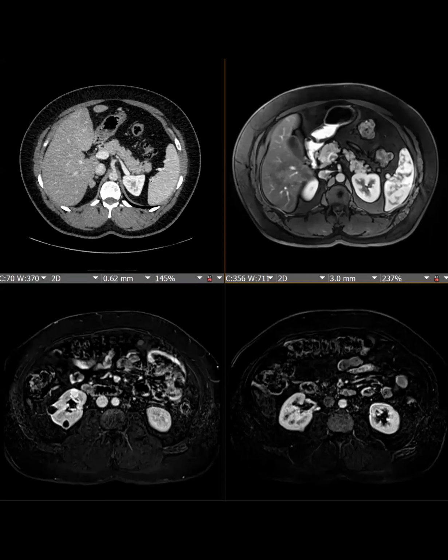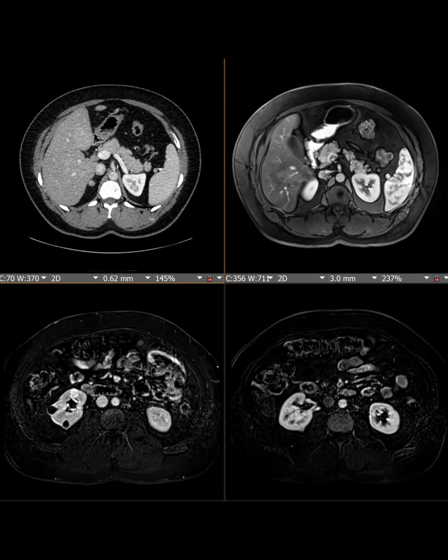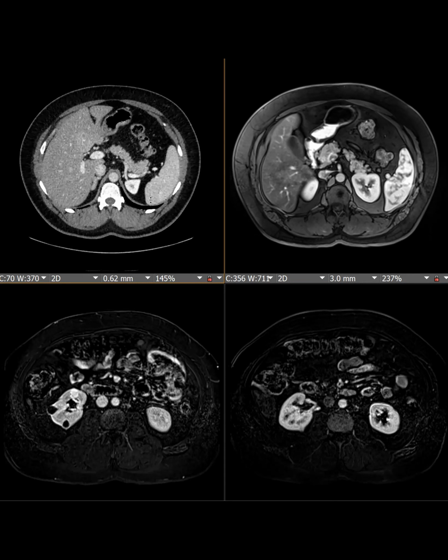This is a case that has 3 different imaging studies. One of them is approximately 7 years ago, one of them is approximately 2 years ago, and one of the last 2 screens down here are more recent. So this was a patient who had a syndrome. But I draw your attention to the fact that the adrenal gland on the left is missing.